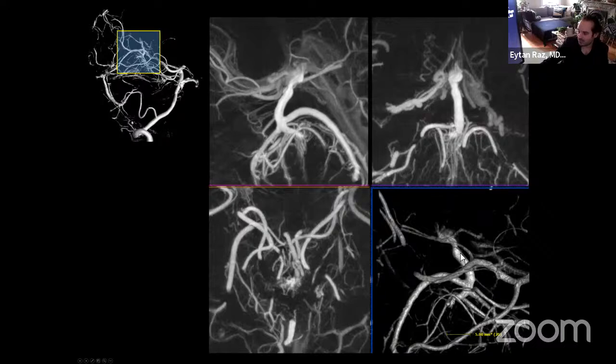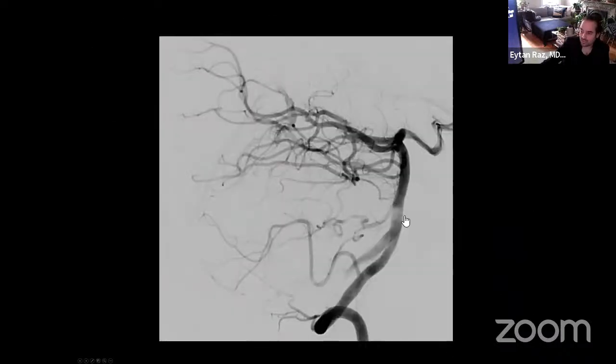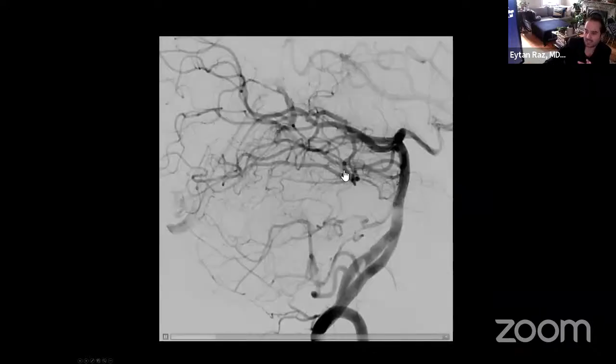This is a precentral vein. You see, this is 5 millimeters. This is quite magnified. And now you try to understand things better, but you have to keep in mind the flow. On the DynaCT, you're not going to understand the dynamic of the flow, okay? It's one picture in time, okay?